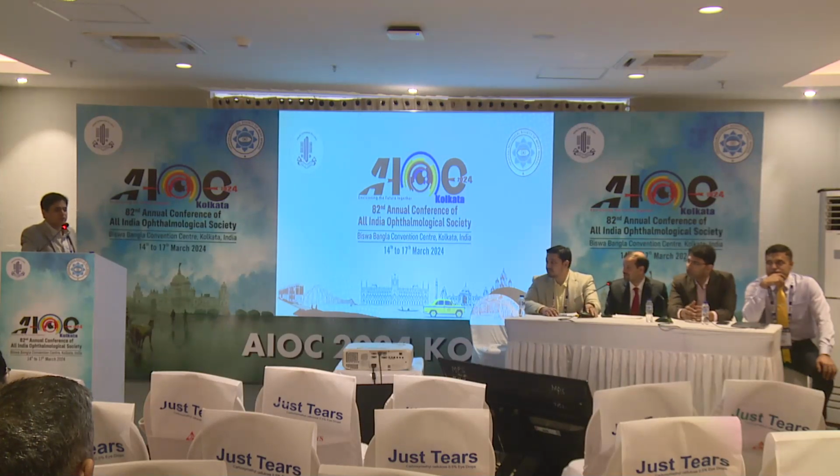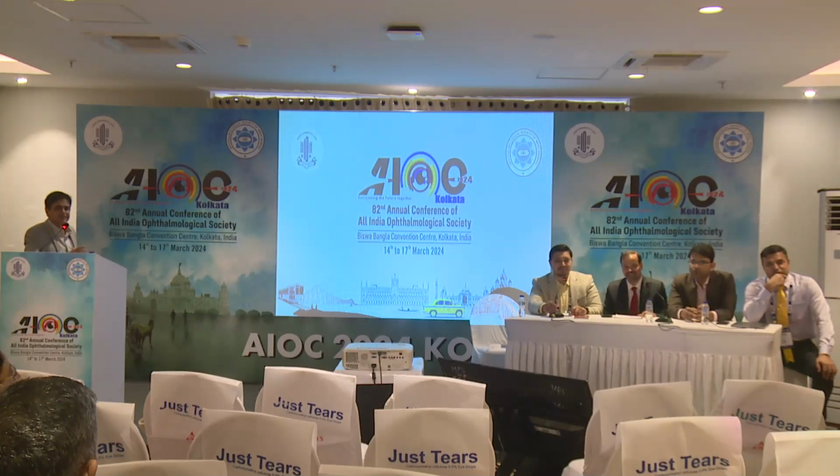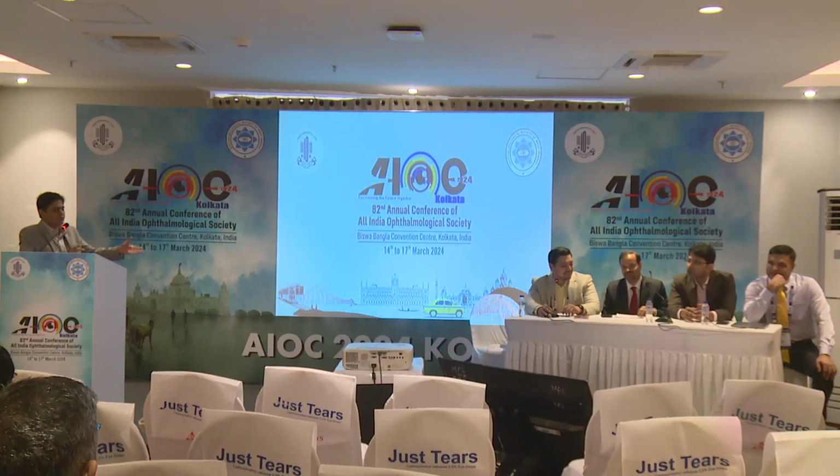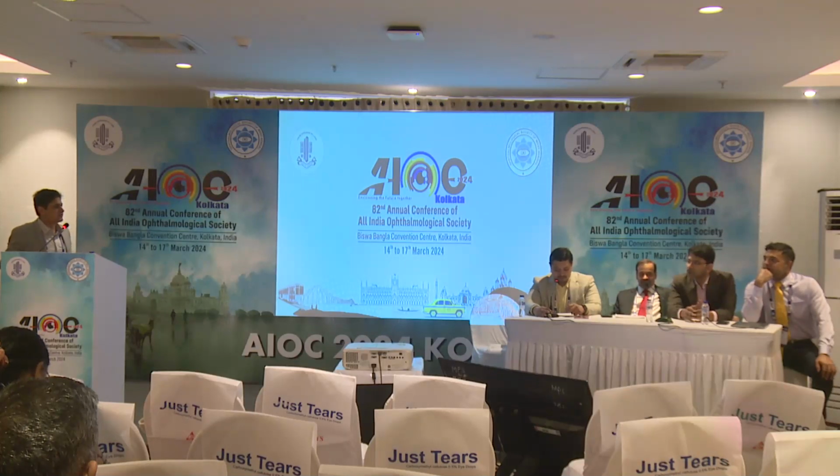So I agree with Vinod. Fully agree. That is what I'm telling you. But sometimes, in private practice, the cost is there because you have to charge for ICG every time. That is the only thing. So that is what I highlighted from both points. ICG is very essential, as Vinod highlighted, but sometimes you can just get away. Maybe if he's not responding, do ICG. But if you have the facility, the patient is ready, I think it is very important to do it.